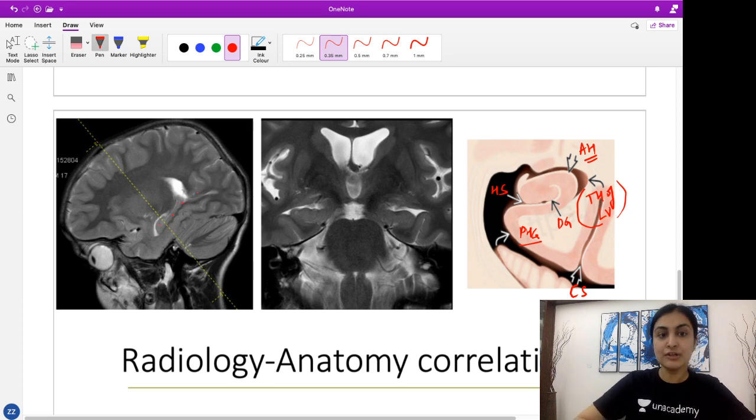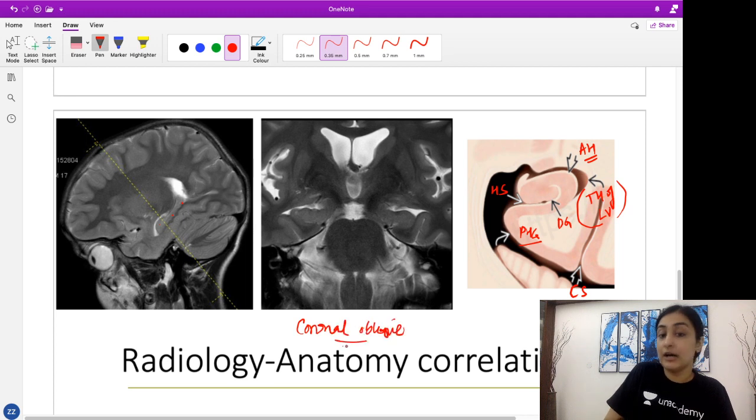Now remember, guys, whenever I want to diagnose MTS, it won't be done on a vertical coronal section. Usually, what do we mean by coronal? It is a straight perpendicular section through the brain, correct? But this particular anatomy appears best when I take an oblique section. Can you see how the section is taken? It's taken in an oblique manner. So remember, the plane of choice, if they ask you, will be a coronal oblique. The coronal oblique MRI image will be most useful in diagnosis of MTS.